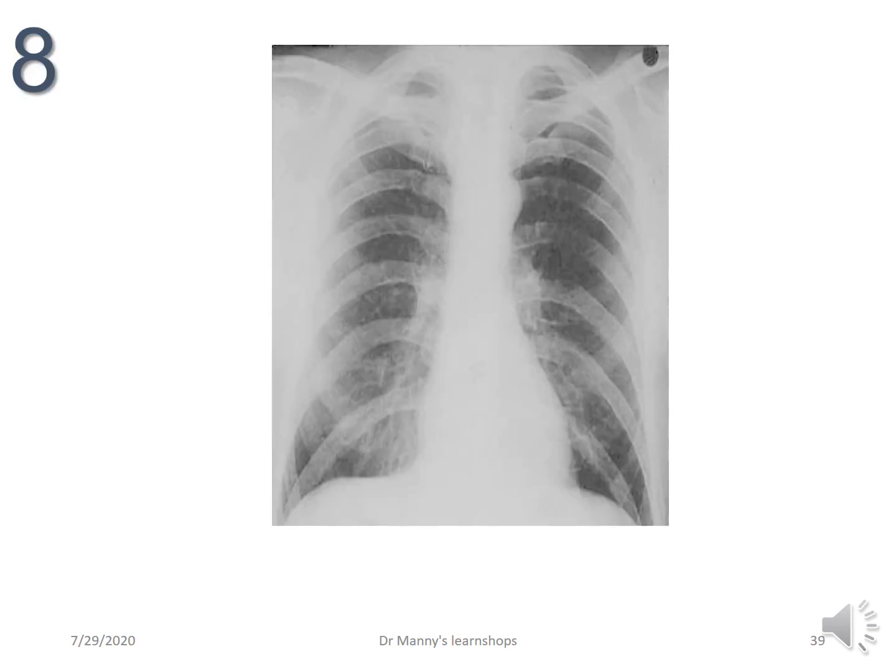Okay, very white chest X-ray. Looks pretty normal, but it's too white. So what do you think? Yep, I probably agree with you. This is an underpenetrated chest X-ray.